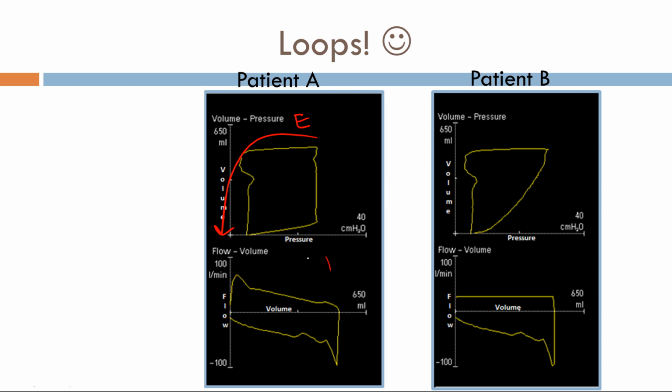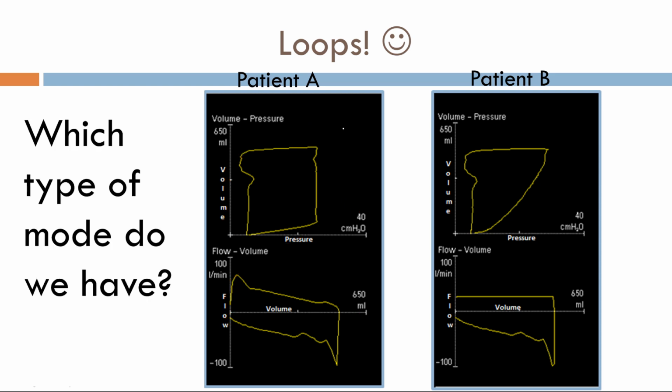Now, I have a simple question for you. Which type of mode do we have for each of these patients? Don't get overwhelmed. Try to figure it out and we'll discuss it. I'm sure you'll get it. Pause the video now.